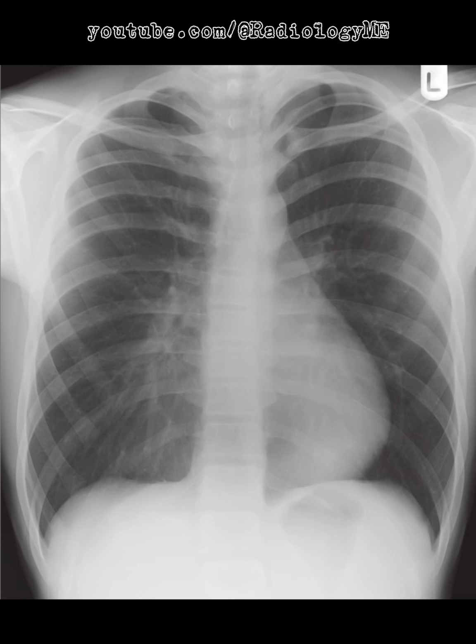Looking at this chest radiograph, the first thing that catches my attention is the increased translucency in the left hemithorax. Now, this could easily be attributed to patient rotation towards the left side, and that's something to always keep in mind when interpreting films. Technical factors like positioning can greatly influence the findings. The right heart border looks a bit indistinct here.